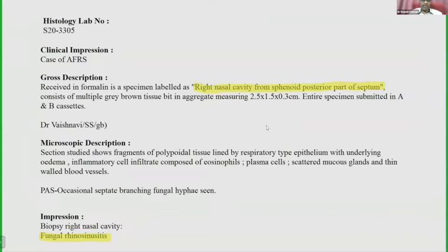The lesions which can appear darker on T2 include again the fungal mass and bone tumors. They are all rare, but well-known entities, including chondrosarcomas, chondromyxoid fibromas, and ossifying fibromas. There are many primary bone tumors we have to keep in mind. What will be the plain CT finding of a fungal mass? It will be hyperdense, sir. Yes, linear hyperdense fungal hyphae, if present, is usually a classical feature, and it can rarely show calcifications also. Okay, thank you.